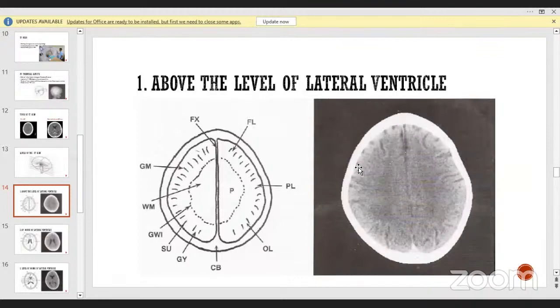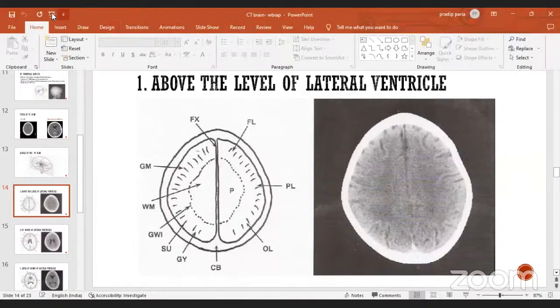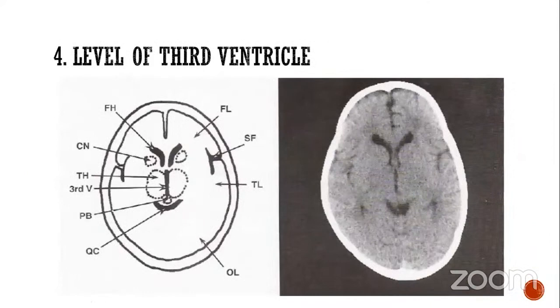That is the white matter, that is the gray matter. And then if you can kindly repeat the slide on caudate nucleus and GP, that is what they want to see on CT scan. Caudate nucleus and globus pallidus. So if you can just find out the section and show them once again. Actually, internal capsule is also important clinically. So you can highlight the part of the internal capsules and that caudate nucleus.